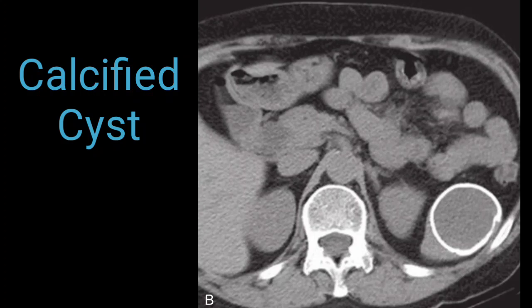This is a pseudocyst. This is not a true cyst, and this is not a congenital cyst. It is likely because of trauma or any other infection, or maybe because of an infarct. So therefore you have to take the complete history from the patient before you diagnose or label the case.